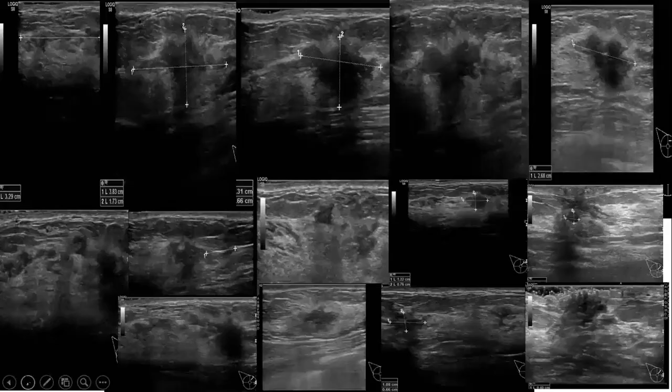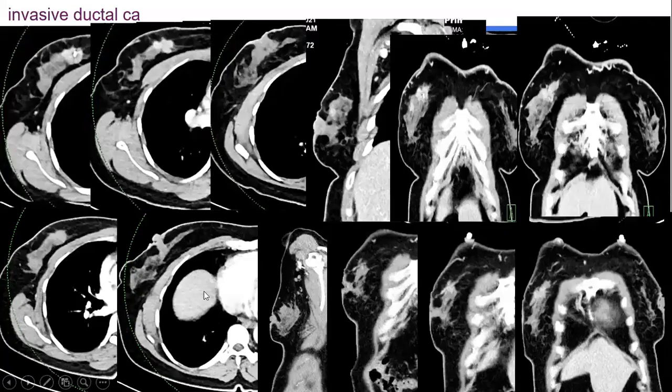And look at the nipple. Here, look at the nipple area. And this is the mass on the axial. Now the mass is definitely getting larger. This is the clip due to the biopsy, the post-biopsy clip. And see that the lesion is larger than the previous.